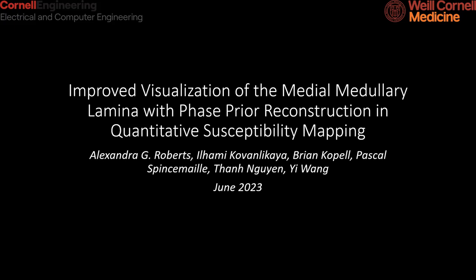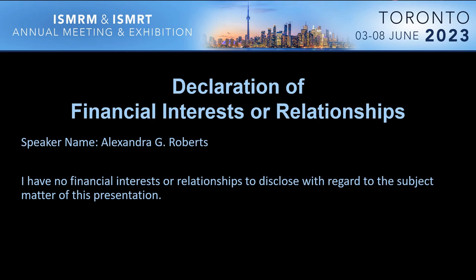I will discuss improving the depiction of the medial medullary lamina structure on quantitative susceptibility maps.